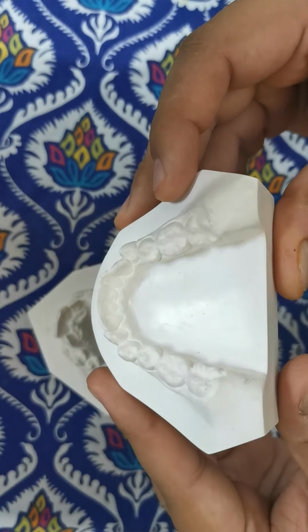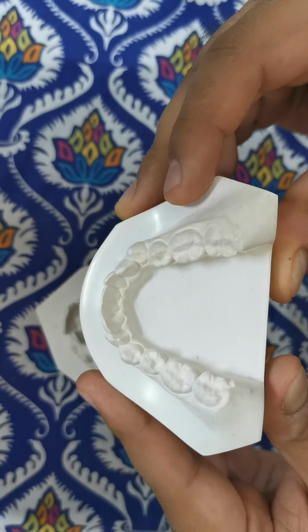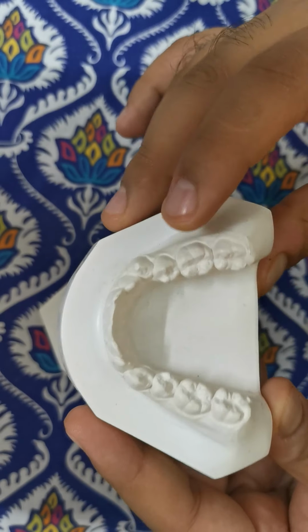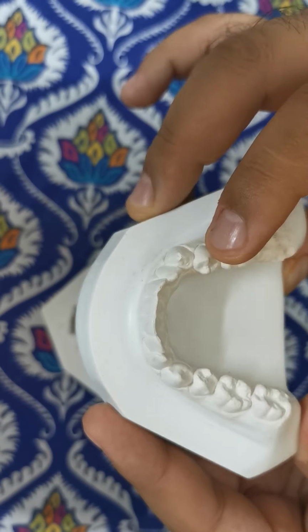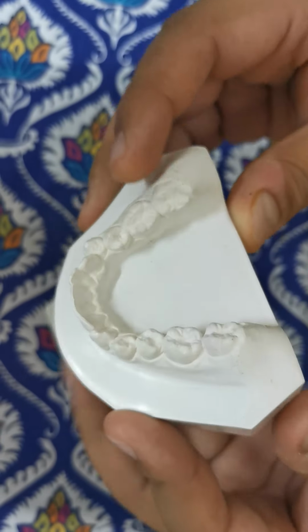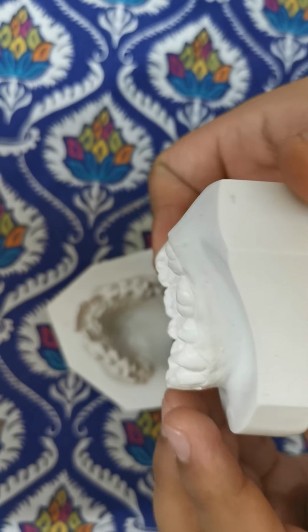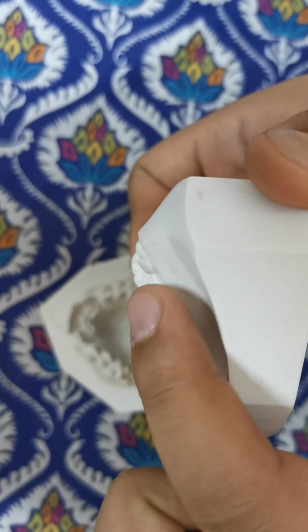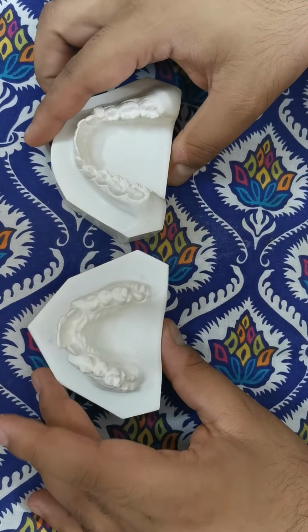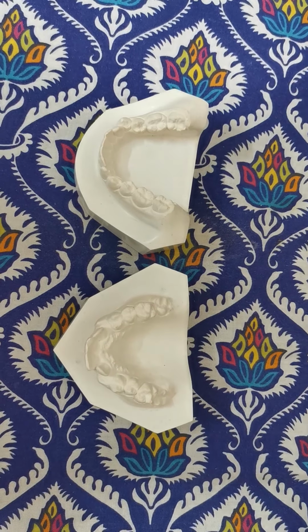In the mandibular cast, we look for the type of dentition present, the number of teeth present, and whether it is permanent or primary dentition. We see if rotations are present or not. We see any carious teeth, restorations, or crowns which have been incorporated. And in this lower arch cast, we also see the curve of Spee, the depth of which is known as the curve of Spee. So this is what we discussed previously in my video about the casts.